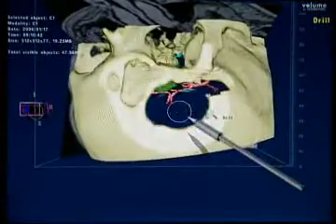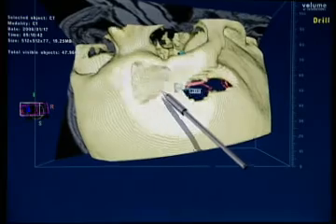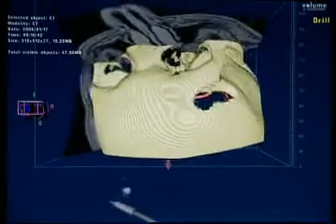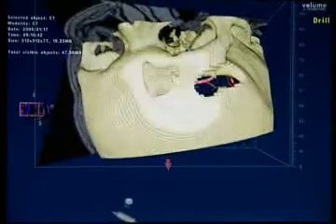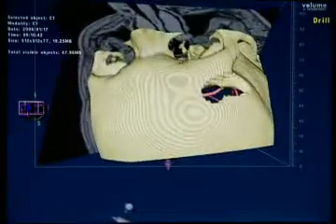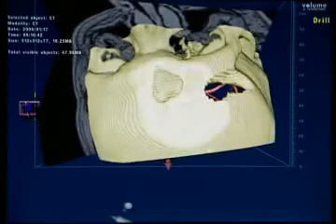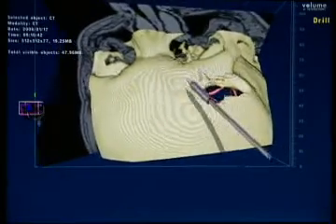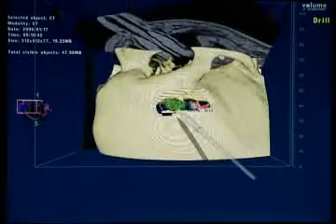One is we would like to avoid going into the frontal sinus, which is here. You can see there's a crop box. So if I bring the object towards that crop box, it automatically crops. I can crop through the whole thing. Yeah? So cropping only through the anterior parts of the CT would give you a nice overview over the sinus. And also here is the porus of the supraorbital nerve. So I also don't want to go as medial as that.